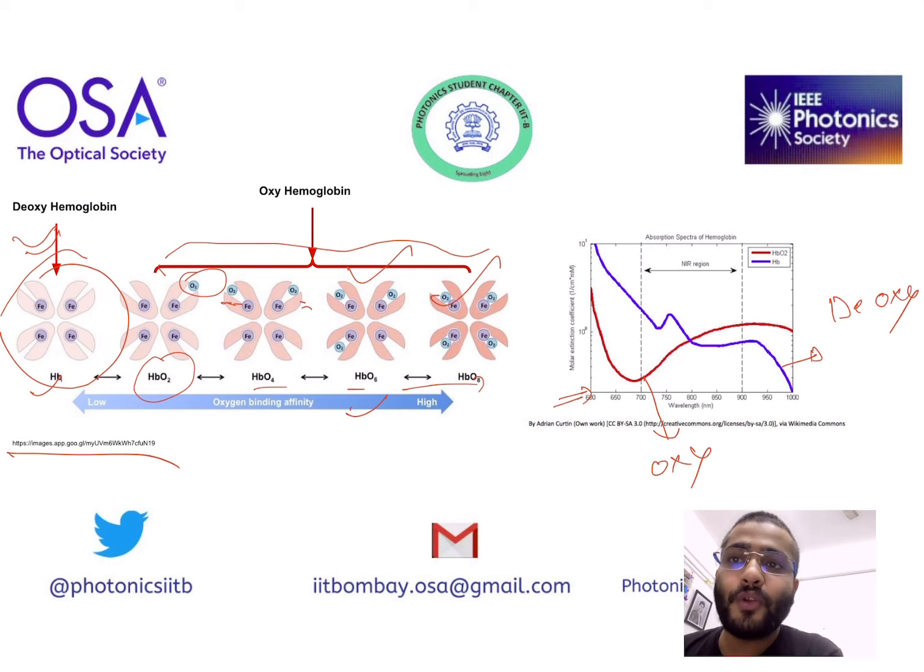You can see the absorption of red light, around 700 nanometer. The absorbance of red light for oxyhemoglobin is very low, and the absorbance of infrared light for oxyhemoglobin is high.